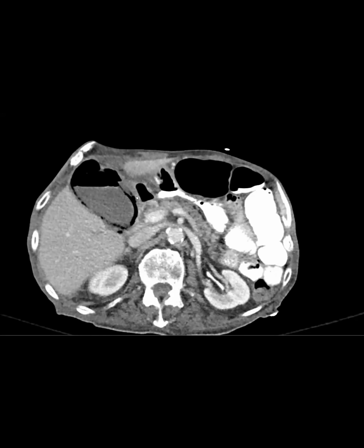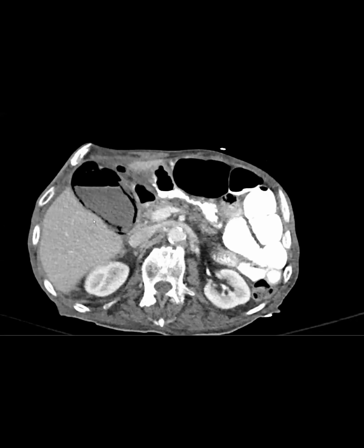The nerves are often denervated at this point, so they might not even have pain. They're high risk, high morbidity. Here we can see it's following in the wall here. So, emphysematous cholecystitis.